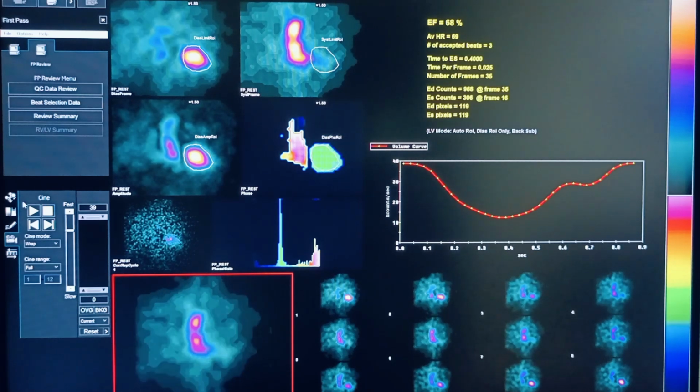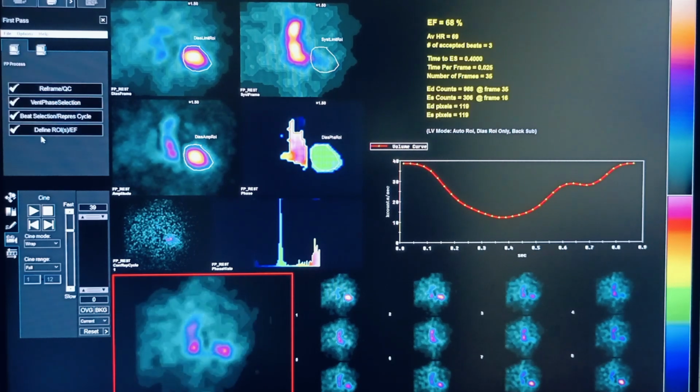So for this study the basic requirement is a good bolus injection. If the bolus injection is not good, you will not get these values. So bolus dose is very critical in this.